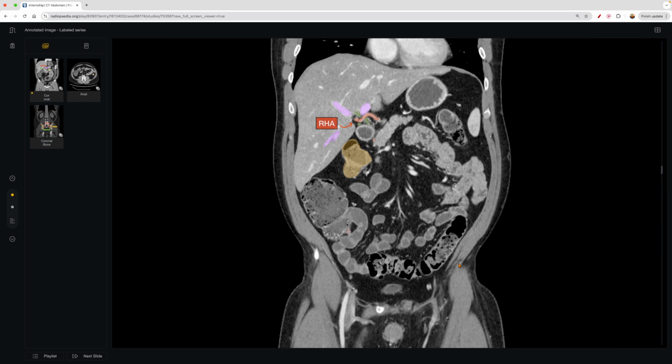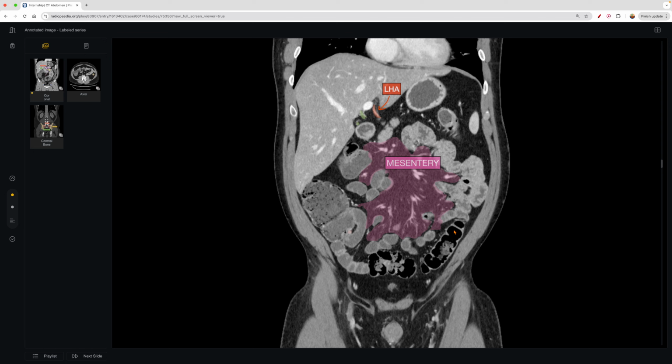And you can see there's actually some fecal matter within the large bowel, and that's entirely normal as well. And you can see sometimes there will be air. Again, when we eat or drink or anything like that, we can consume air. Again, perfectly normal.